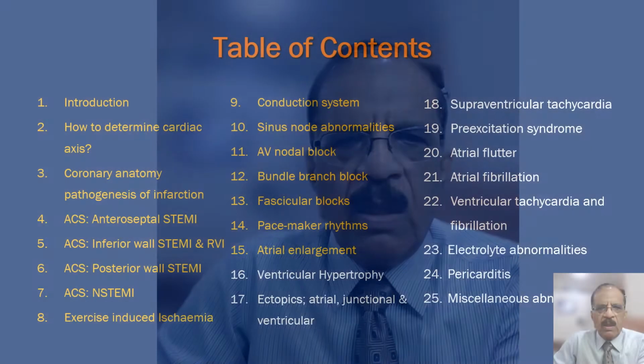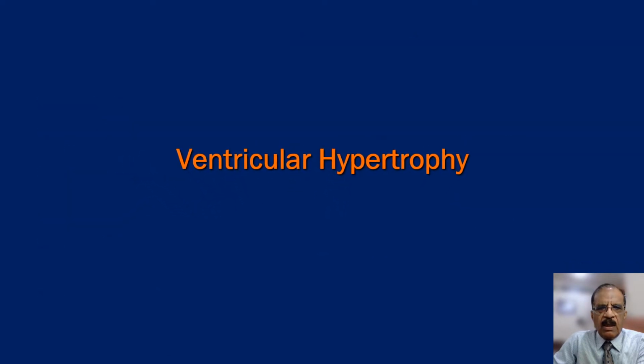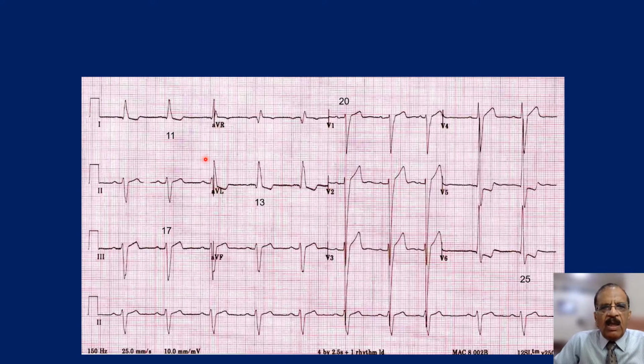But since we are doing the ECG module, let's cover this. We have covered all these, and we are going to talk about ventricular hypertrophy. These are my affiliations, and let's start with the module. Let's see this ECG, and let me explain one thing.